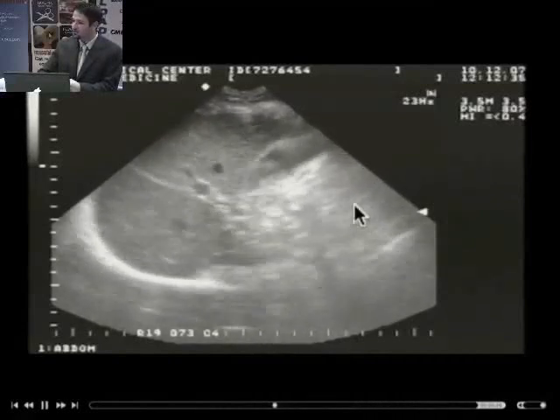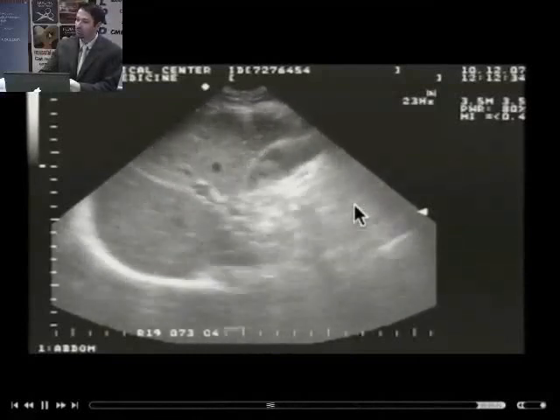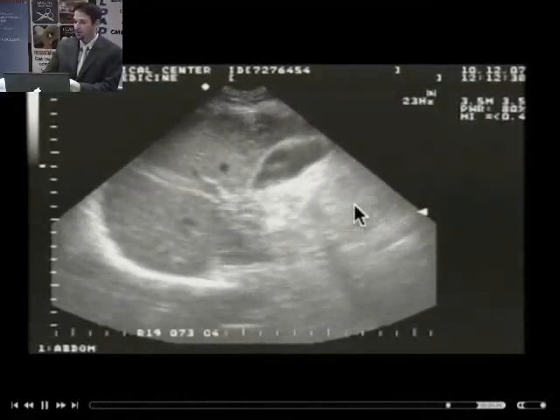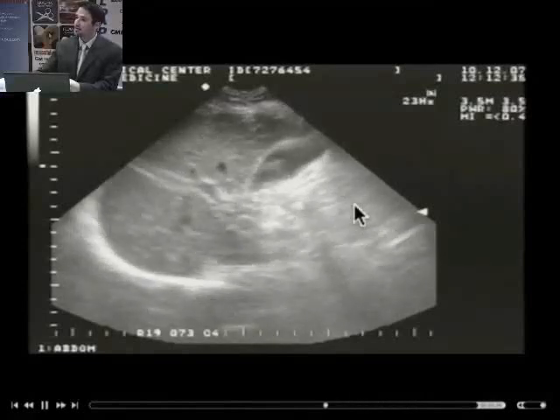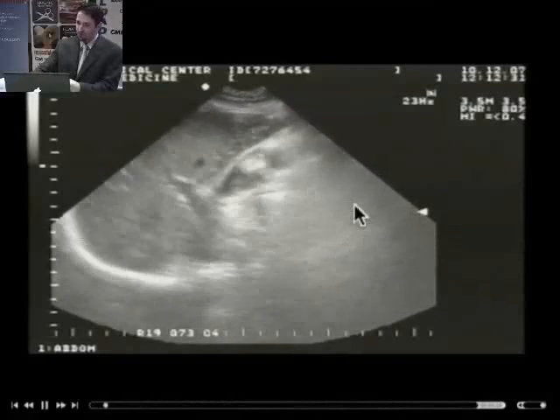It's kind of a streakiness. It's not the curtain of just a dark beam that you see with stones. So it's a very common pitfall with the gallbladder, because the colon can lie right next to the gallbladder and indent the wall of the gallbladder a little bit and give you that artifact. So be very careful with that pitfall.